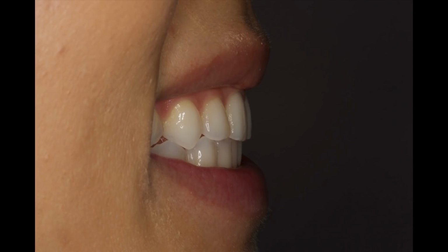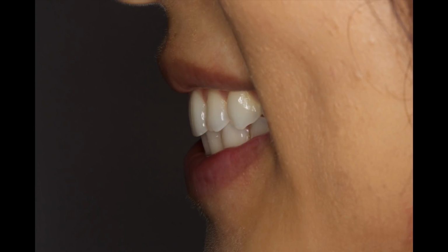For full face and profile photographs, plan a neutral colored spot near a wall where the patient can stand and face their body and head in alignment at all angles needed for the shots. Always ask your patient to face their entire body the direction that you want the head to be pointing to avoid an unnatural stretched appearance. Instead of using a black background for close-up smile photos, keep the camera set on your preferred extraoral image settings and move in close. The background will automatically go neutral or black and only your subject will come into focus.